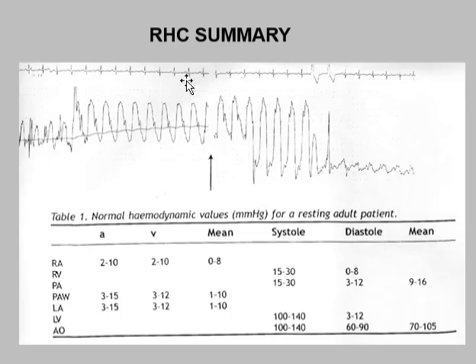And here is another slide showing the pullback in more continuity. The wedge, pulmonary artery, a break where the thermal dilution cardiac output is taken, the pulmonary artery followed by the right ventricle and followed by the right atrium. Notice there are spikes due to movement here and here, and a lot of noise as the catheter is wobbling free from the lodged position. A little spike from catheter whip. Catheter whip is called catheter movement artifact.